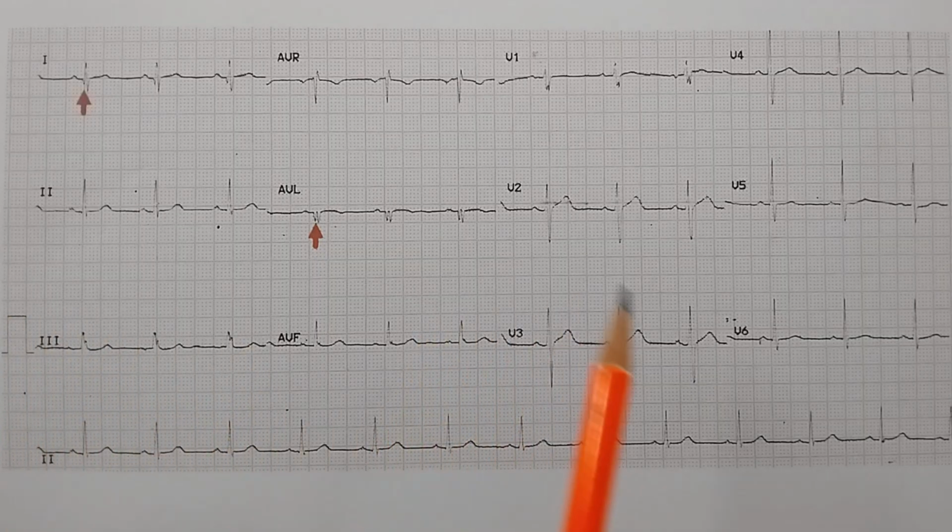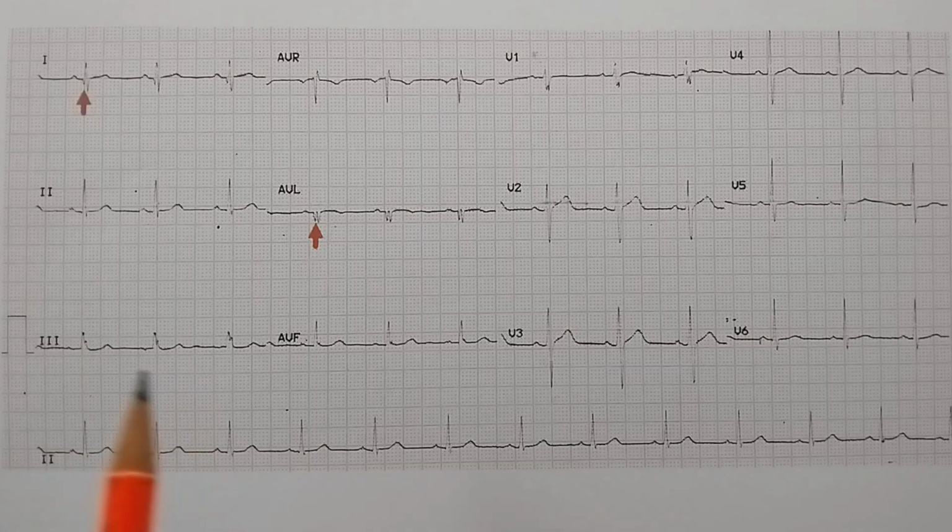Fragmented QRS is a recent introduction, maybe a decade or a little more than that, and they have significance in that they indicate abnormal conduction and they are prone for arrhythmia. Even though this is a very subtle finding, those persons have a higher risk of ventricular arrhythmias. So ECG, to sum up, is very useful in diagnosis or rather confirmation of acute myocardial infarction, and it is widely available, very minimal expense.